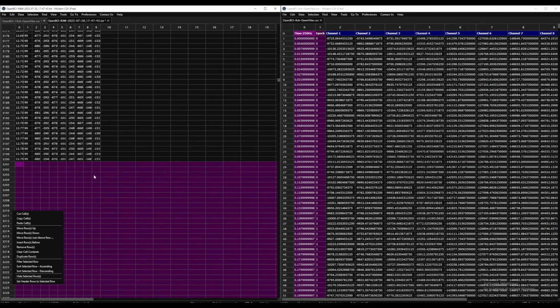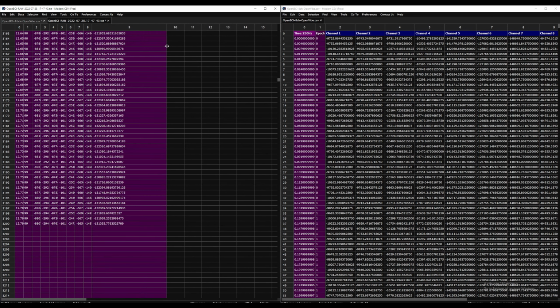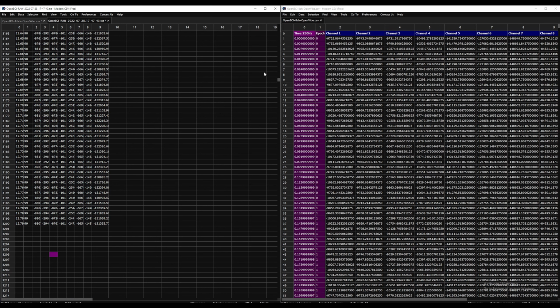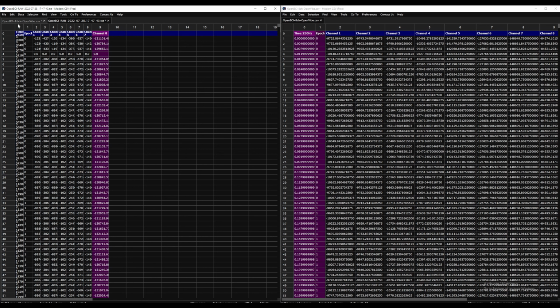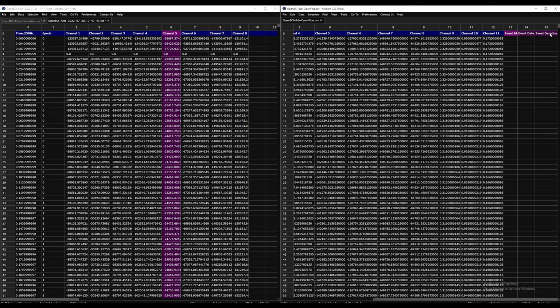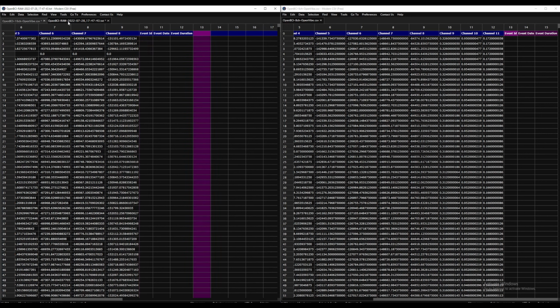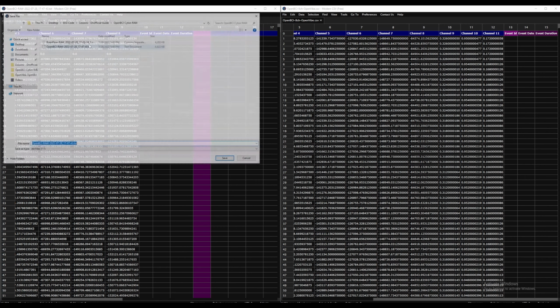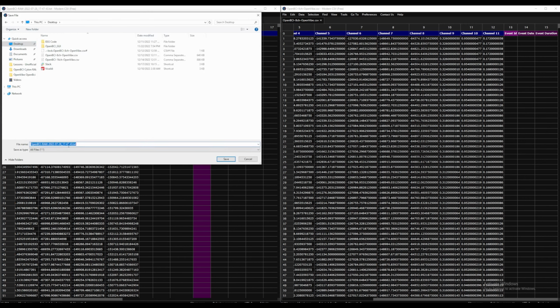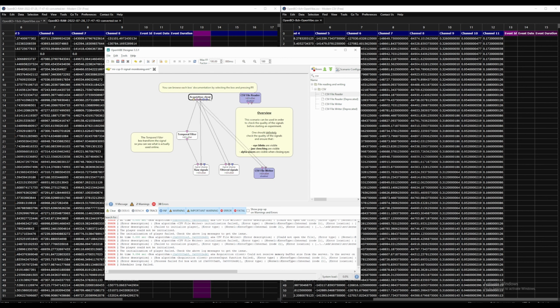Delete. There we go. Well, I don't know how these got smaller, but I should just add these 3. Got deleted. There we go. And if I save this, we should be able to just read it with OpenVibe. So let me enable this again.